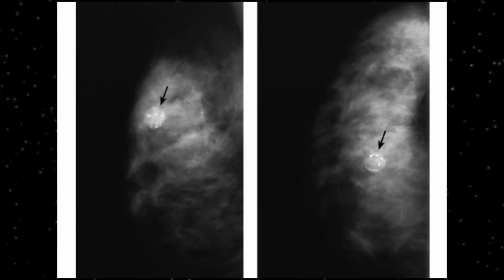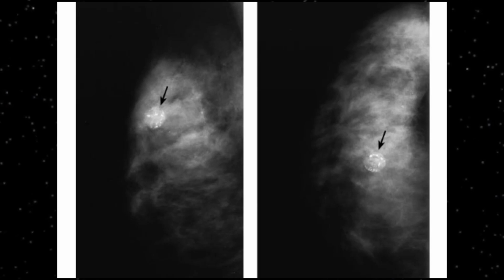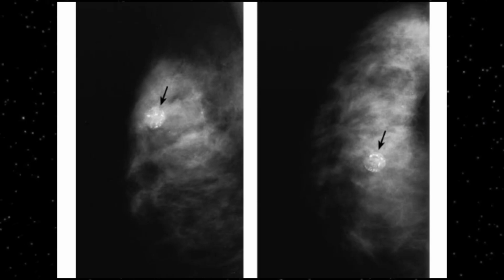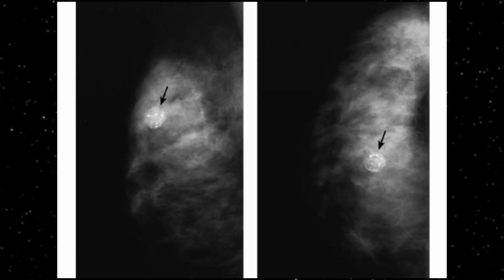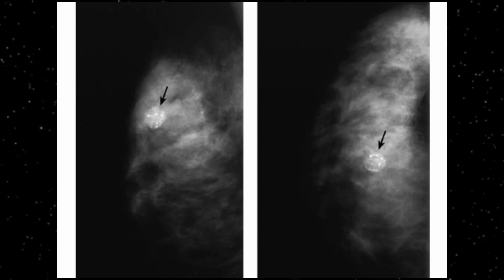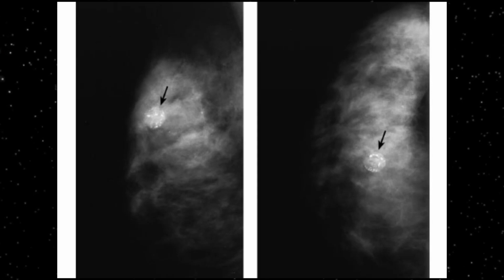Fat necrosis will give rise to a particular presentation. It would be like an eggshell calcification. Here on this image you can appreciate very clearly, indicated by the black arrow, this is called eggshell calcification, and this eggshell calcification is usually seen in fat necrosis. In some cases it will also be in the wall of an oil cyst, but here fat necrosis gives rise to particular eggshell calcification.